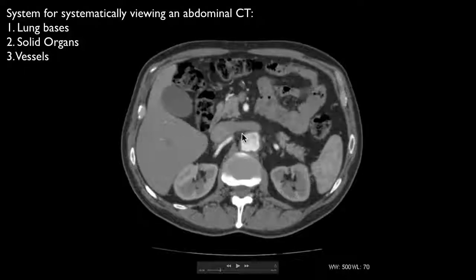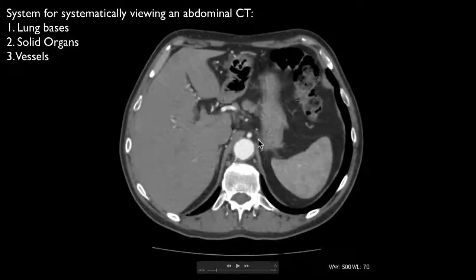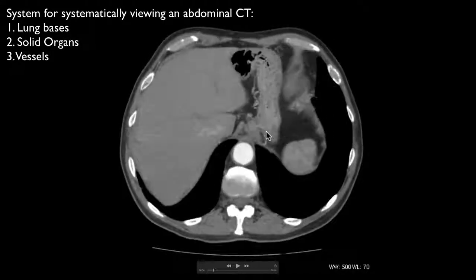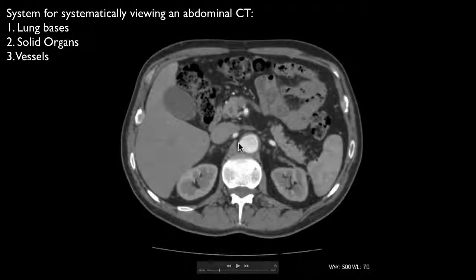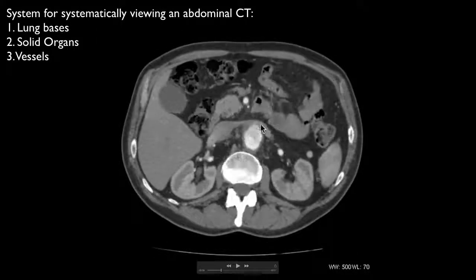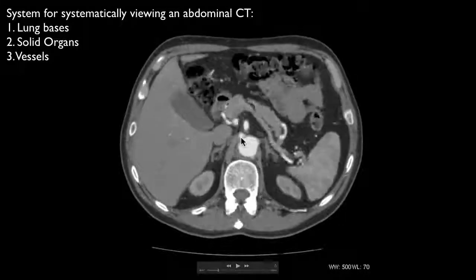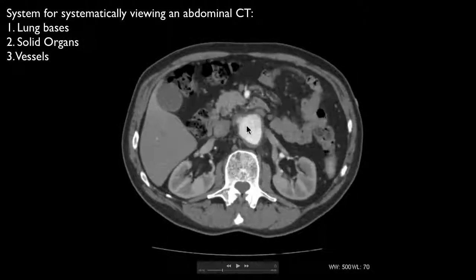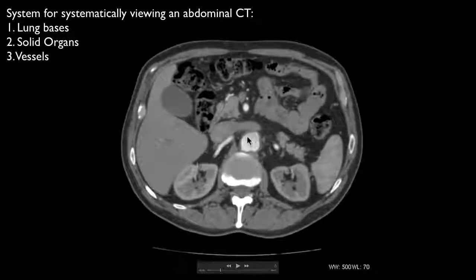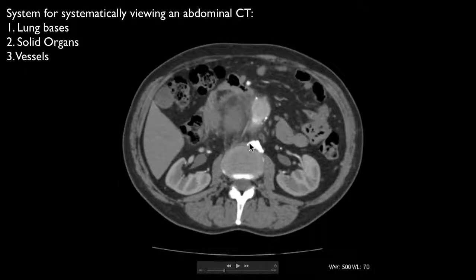Yeah. So a lot of these get stented now, and you want to know where the renals are, because if you put the stent across the renals, that's bad news. You can put stents down the renals, or have little slits for the renals, but you need to know beforehand. Generally for emergency ones, though some centres will treat aneurysms with stents into the visceral arteries. Generally for ruptures in the acute setting, because you don't have time to get a special graft, you need to make sure you've got a neck beneath the renals to put your graft in. We have in this one.